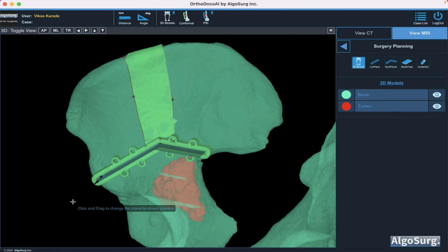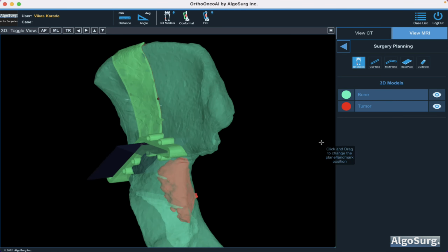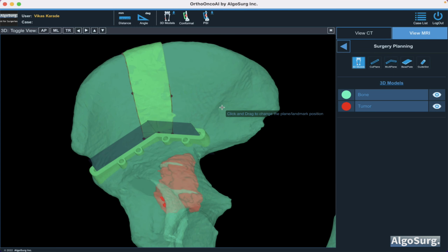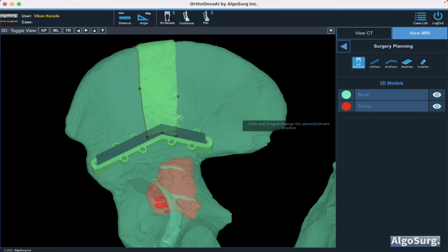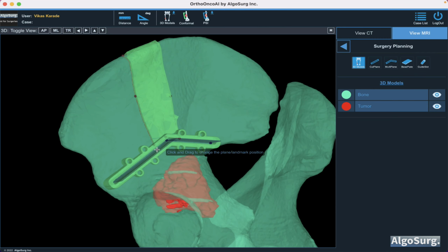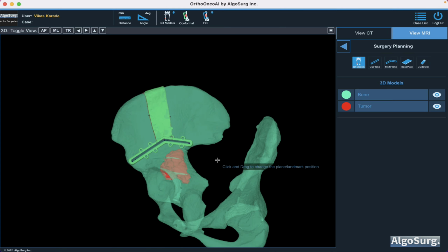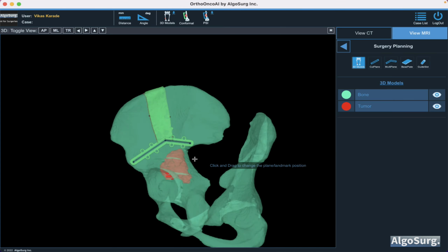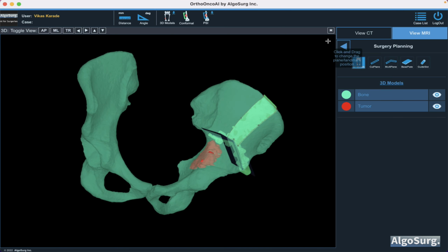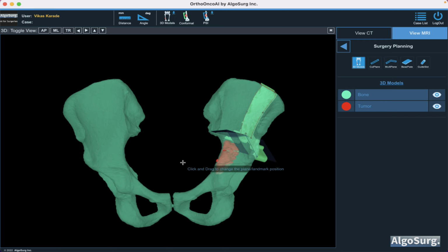Now this PSI thing is still under development. A lot to be done to make clean mesh out of it, and more design parameters and design ideas will be added to this. Not only that, we will use this cutting plane plan to guide surgeon intraoperatively using AR glasses. So that is also another project we are doing currently. So that's all for the OrthoOnco AI first demo.